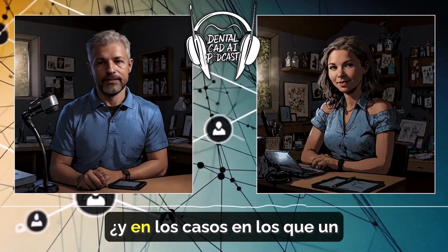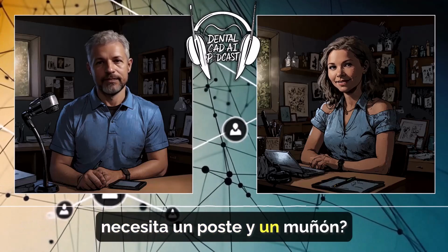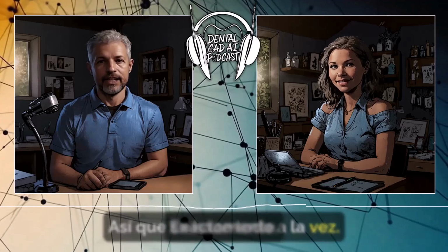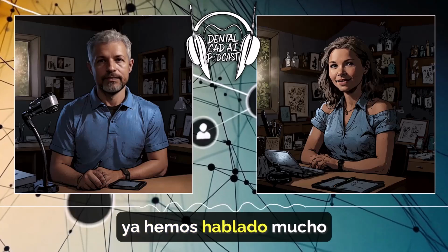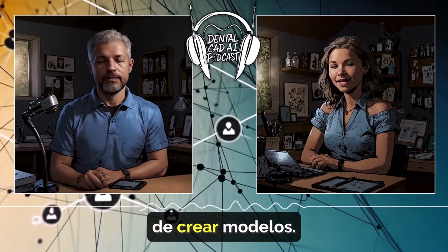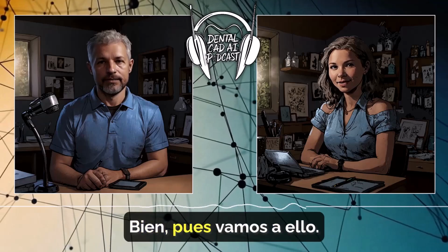That's brilliant. Okay, but what about cases where a tooth is so damaged it needs a post and core? Well, Elefsina streamlines that process too. Oh, really? Now, the post, core, and crown can all be designed in a single step. So it's all done at once. Exactly, way more efficient. That's great news for patients. Okay, so we've covered a lot about restorations, but I hear there's even more to Elefsina, especially when it comes to creating models. Oh, yeah, there's a whole other side to this software that's just as important. Okay, well, let's dive into that then.